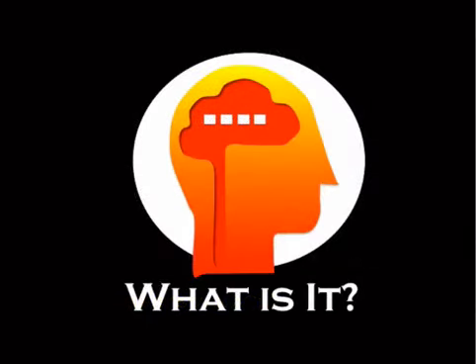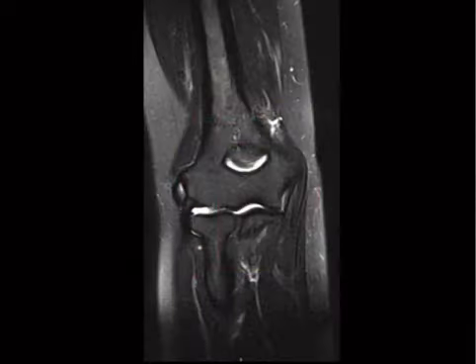All right, so that's it for the knee. We're going to move into the elbow now. Elbow, people are often even less common or familiar with. So just to orient you here, it's the radius, right? That makes that the ulna. Put your hand in anatomic position, so palm facing forward with your thumb out, and you will figure out that this is the lateral side, right? So your radius is lateral in anatomic position.